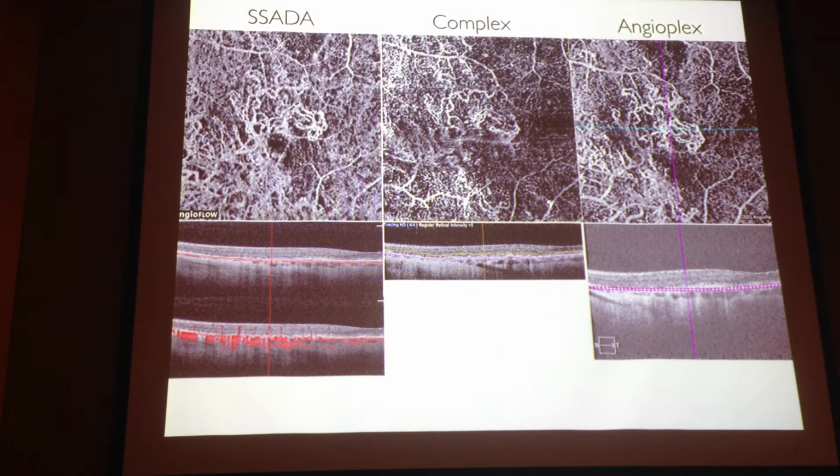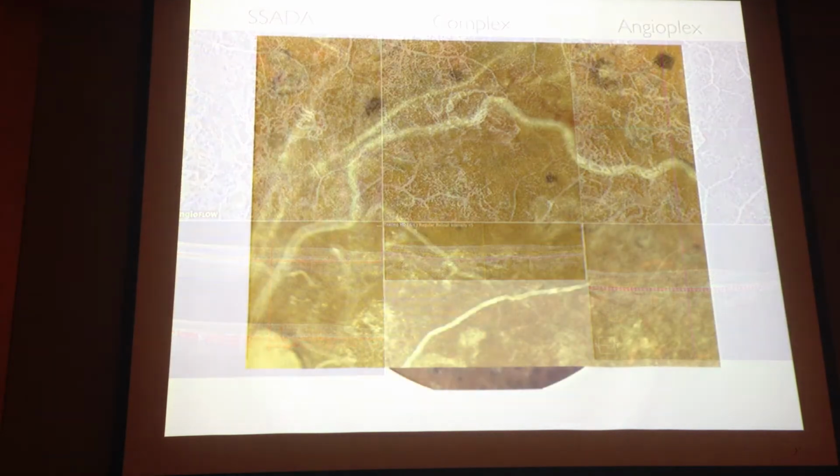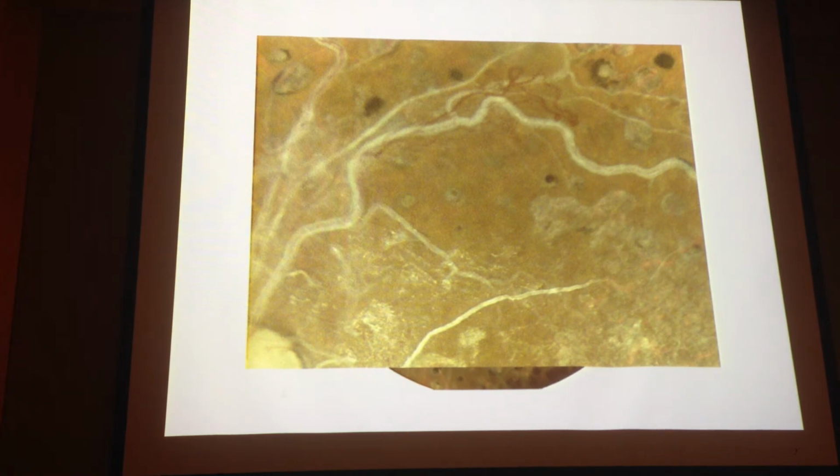And for another choroidal neovascularization, you see the same lesion seen with three different modalities.